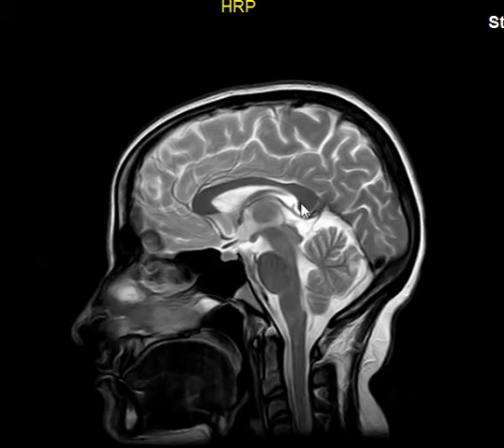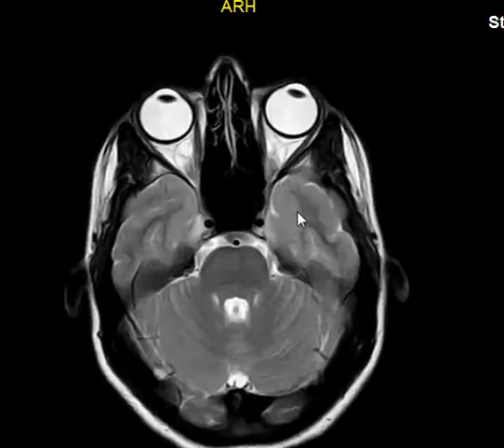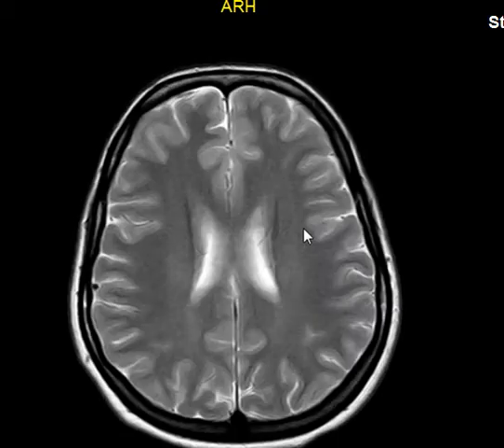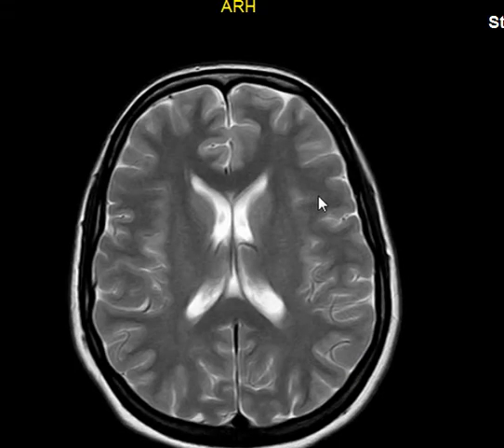Sometimes when you read, there are things called the subcortical U fibers. It looks like the letter U. These are the axons, or the wires, let's say, that connect one gyrus to another, like here. It is subcortical; this is the cortex.